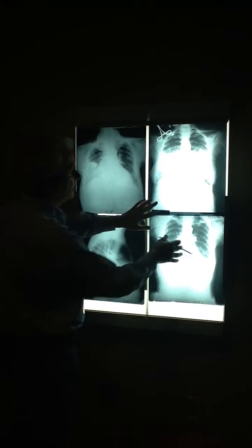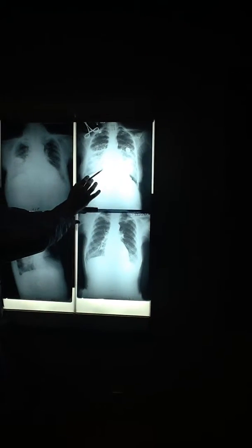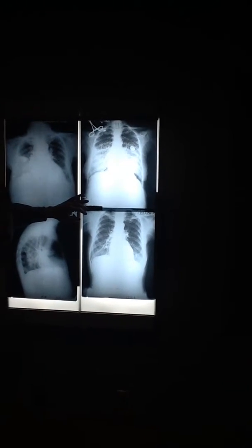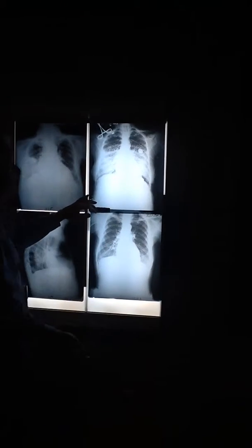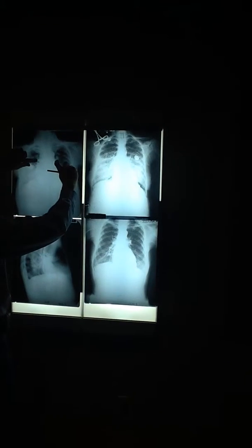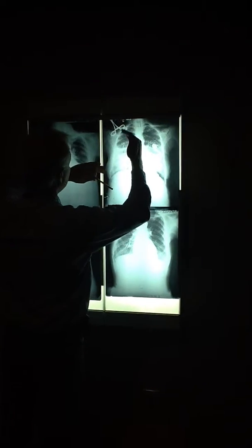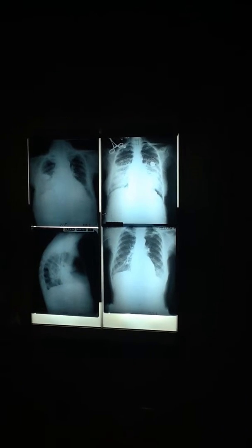Great example. Now, this patient here, which has a much better sized heart, you see that compared to here? Much better sized heart. Relatively, pretty much normal heart. Do we have big, prominent upper lobe veins there like we do here? No, we don't actually. But look at the density in here. See it here? The whole lower half is... it doesn't go all the way up here, but it's a pretty good part of the medullary portion of the lung.